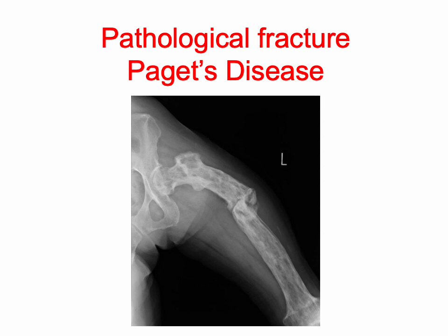Paget's disease is a relatively common metabolic bone disorder characterized by excessive or abnormal bone remodeling. Usually the characteristic radiographic features are expanded bones with coarse trabecular patterns. It usually affects the pelvis, spine, skull, and proximal long bones, and you can have various patterns of involvement like monostotic or polyostotic Paget's.